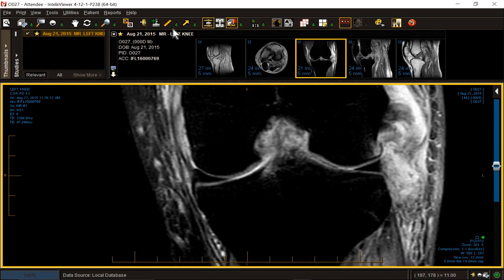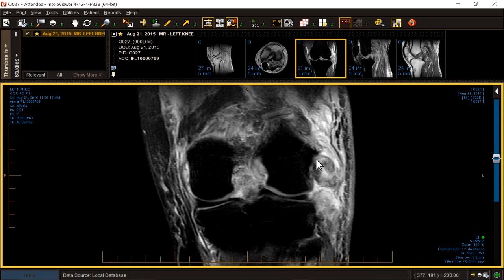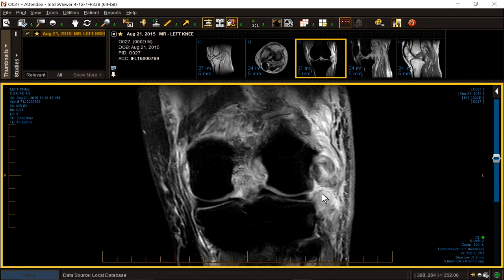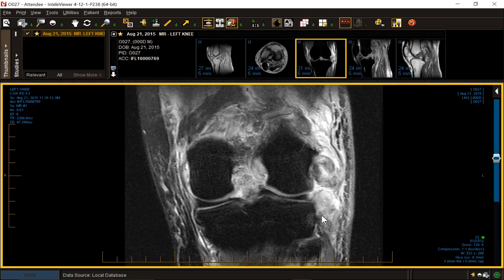All right, let's look on the lateral side now. On the lateral side, we've got a ruptured fibular collateral ligament, a ruptured popliteus tendon. We have ruptured the capsule. We have a Segond sign. It's subtle, but there it is. A little flake of cortex is off. There's a little edema here, and the oblique ligament is off. So we've got a lateral capsular rupture.